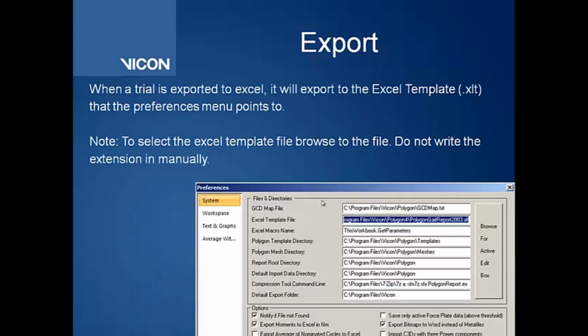And once you export these trials into Excel, it's going to use an Excel template, whichever one you are pointing it to. And so again, that's under the File Options menu. And then it's got that Excel template file you can see right here in the middle. And so that's where it's going to automatically send any of your data.